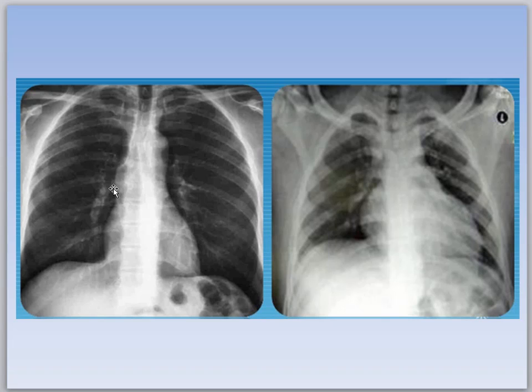So here's normal. Here's the right hilus region, left hilus region in general, right ventricle. Aortic knob you can't see very good. A nice left side of the heart there. There's the left ventricle. Okay, normal. I won't go into the ratios, but just kind of get an idea. This is how big the heart should look in relationship to the chest, the pleural cavity. See the trachea real nice here. Now look at this one. This is actually a beautiful example. What is going on here? Although it could have been taken with a little bigger inspiration.